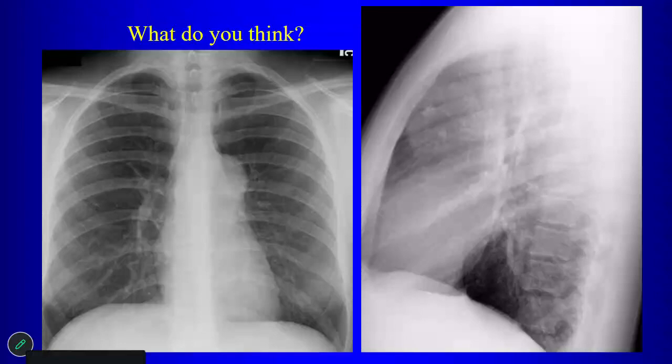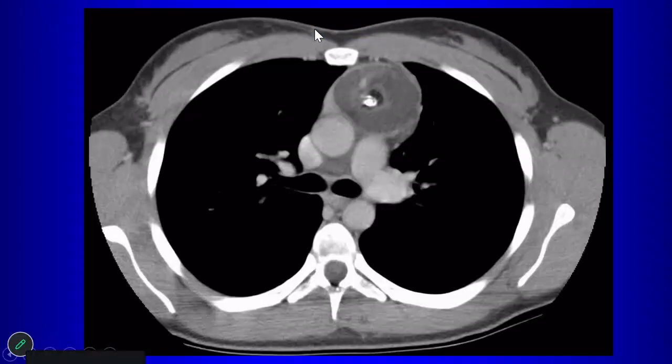See anything on the lateral view? There's a calcification. So what are you thinking about? Yeah, so another germ cell tumor, and then here you might think about what is the most specific feature for teratoma here? There's fat. Fat, right. So fat in the lesion.